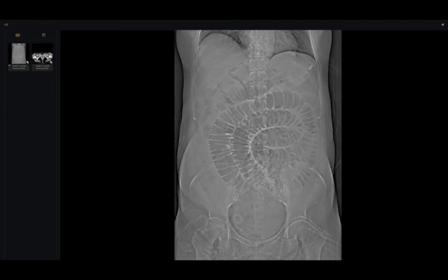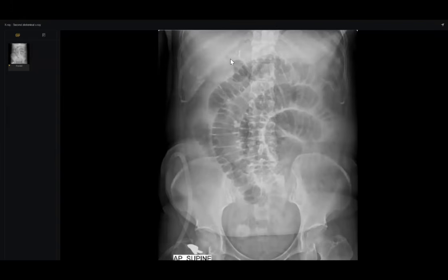What happened here? Look here. In X-ray, don't expect that the lucency in the pneumobilia will be very clear. Look here, this is the lucency here. At least those. So don't judge. There is no pneumobilia before zooming.